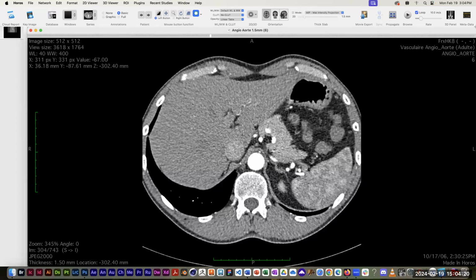So we're just barely seeing part of the kidney here. So I'm just going to click a few little dots, closed polygon. And now here's one of the weird things about the closed polygon tool. Maybe I should try the open polygon sometime, but you would think with closed polygon that, like with Illustrator, what you want to do to enclose a shape is come all the way back around to the beginning, click on the starting point. Don't do that. Go all the way around the object you're trying to trace and get pretty close to the beginning, but don't click back on the beginning point. And I'll show you why.